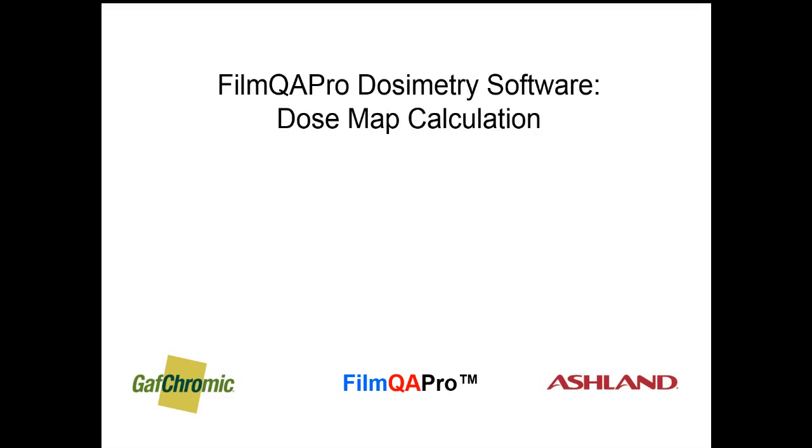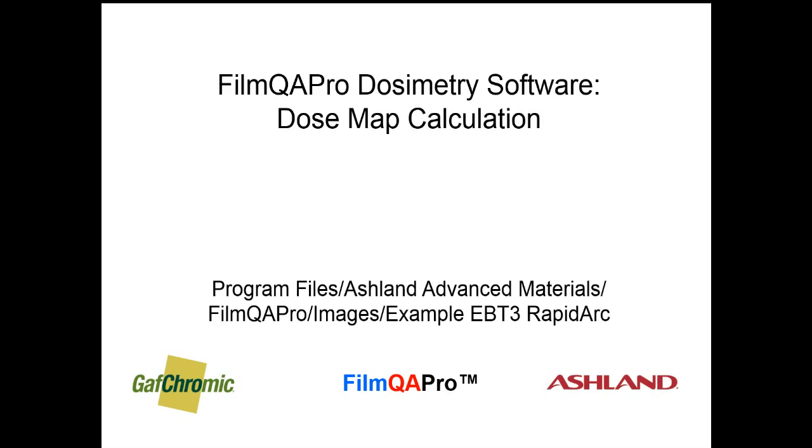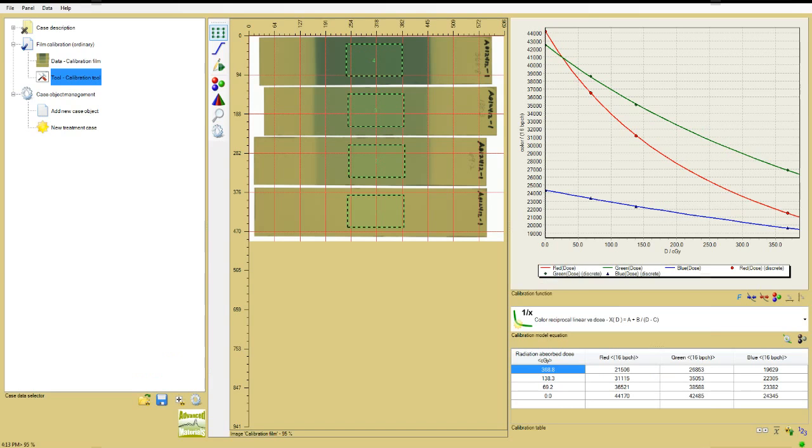Assuming you've completed the film calibration step, I'm going to show how to calculate a dose map using the EBT3 Rapid Arc example included in the Film QA Pro installation package. The route is shown on the screen. With the calibration object in place and completed, the next step is to add a dose map object.